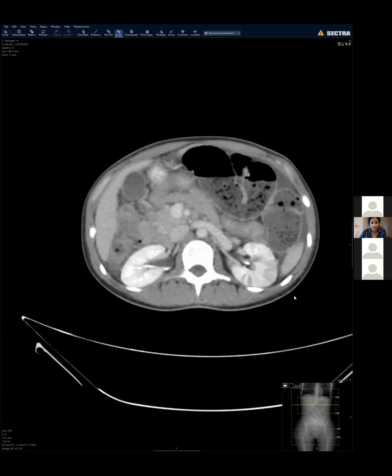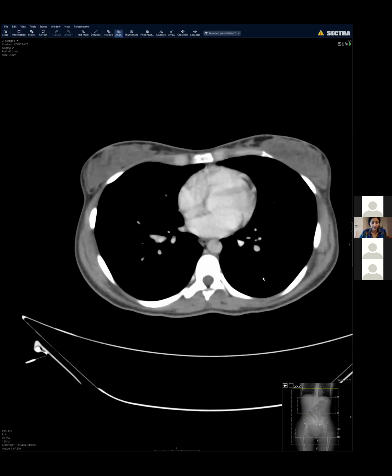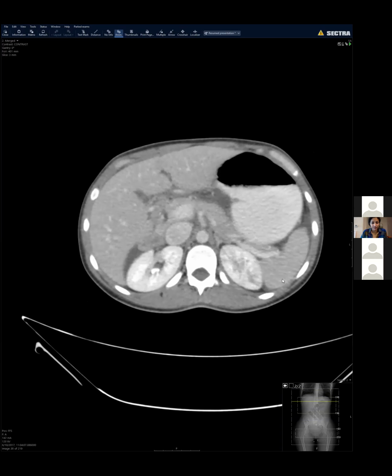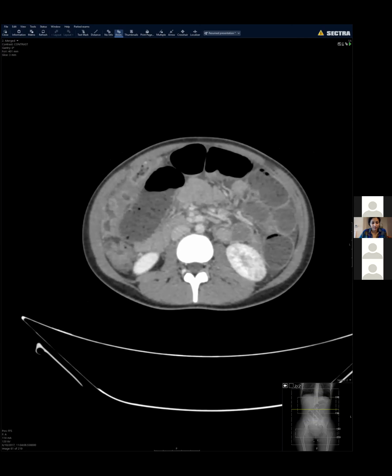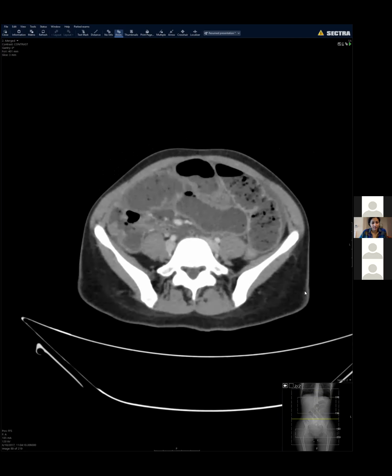What we saw of the breast didn't show any masses. We caught just the bottom end. Stomach didn't show any masses, which would be common suspects for a mucinous primary in the abdomen. But of course, this workup would not be complete.